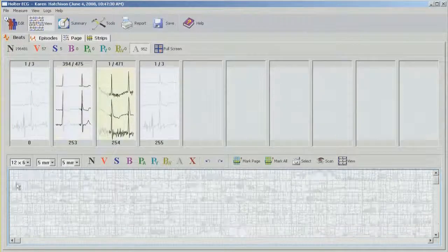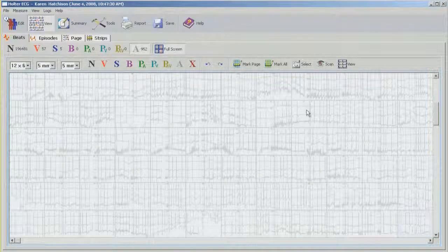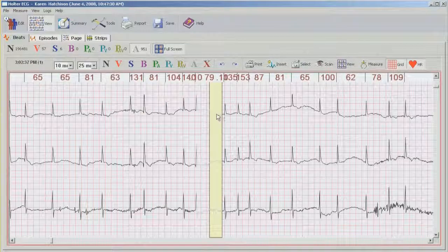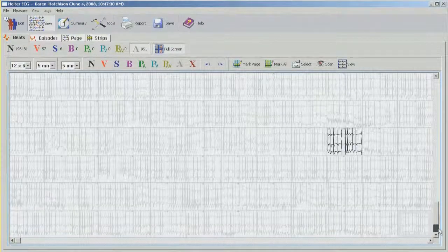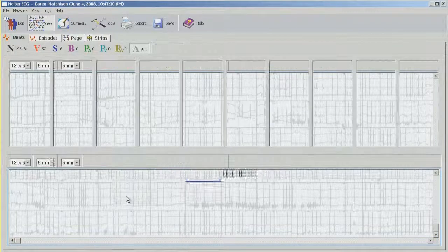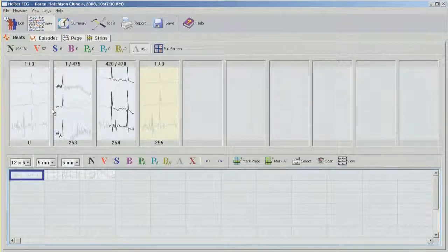And moving on to bin number 3. And we'll look at this one and change this to normal. And the last bin, only 3 characters, and I can see there's just a mess here, so I don't need to go into any details. So we finished editing through all the beats right now.